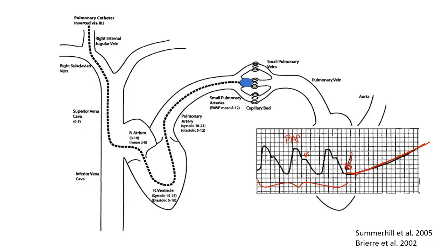You may have seen a subtle change in the animation, but imagine over here, let's say we have our artery, the pulmonary artery. Normally when we inflate that balloon, it's a nice sphere. It takes it up perfectly.